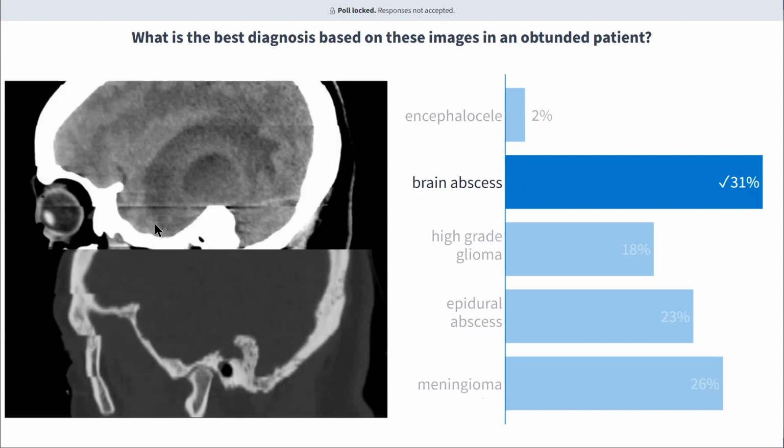lifting up a carpet here, more like a bell curve shaped kind of thing, a rounded thing like this, or potentially more crescentic. And this thing just looks like it's extending far too much into the brain parenchyma to be simply extra-axial. And the degree of parenchymal edema as well suggests that either it's extra-axial with brain invasion or it's actually intraparenchymal. And this turned out to be intraparenchymal.